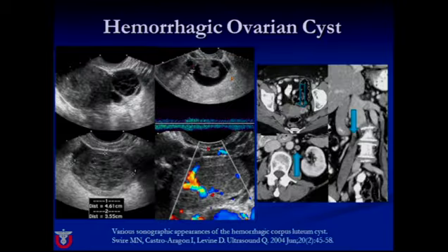Moving on to the ovary. We all know that hemorrhagic cysts can look like anything. And it's important to remember that no matter what you're doing or what patient you're seeing, a common condition is more likely than a rare condition, and an unusual manifestation of a common condition is still much more likely than a zebra. And this reference talks about the different appearances of the hemorrhagic corpus luteum, and it's quite useful to develop a visual database.